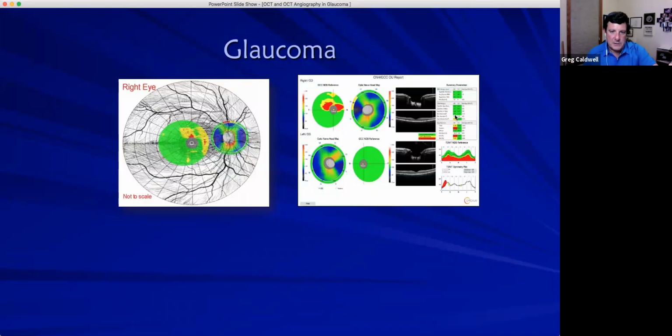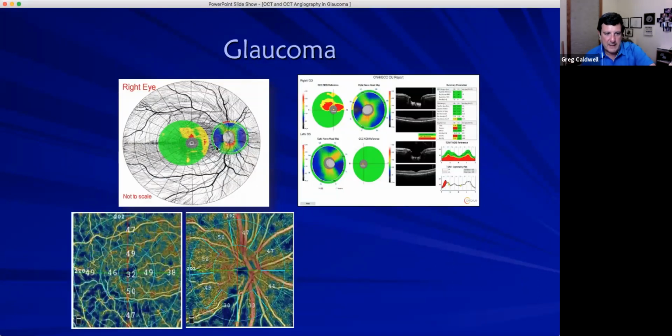Going back and putting that into correlation, that's that structure test of ganglion cell. See how this is arcuating around right here. Here's that optic nerve, and this is a superior. This here is not this case, but showing, remember, thin here should create maybe something eventually thin superiorly, arcuating around. Here you can see that nice little wedge defect and how it arcuates around, right around this way.